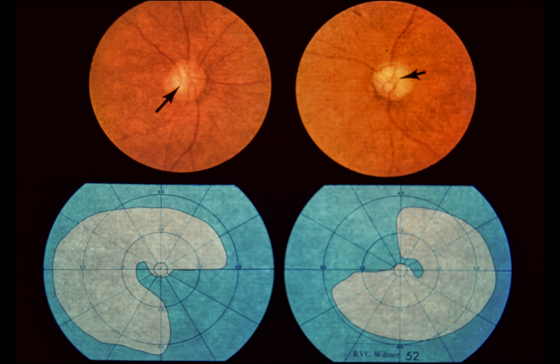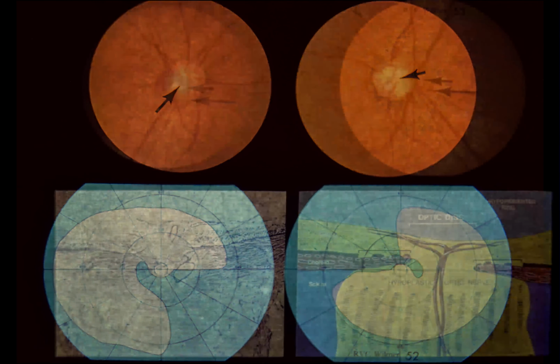Lower left and lower right. The visual fields show bilateral, absolute arcuate scotomas. Although most optic pits are located at the mid-temporal or inferior temporal margin of the disc, they may also be located in a central position. Visual field defects in patients with central optic pits include arcuate scotomas, enlarged blind spots, and quadrantinopic defects.